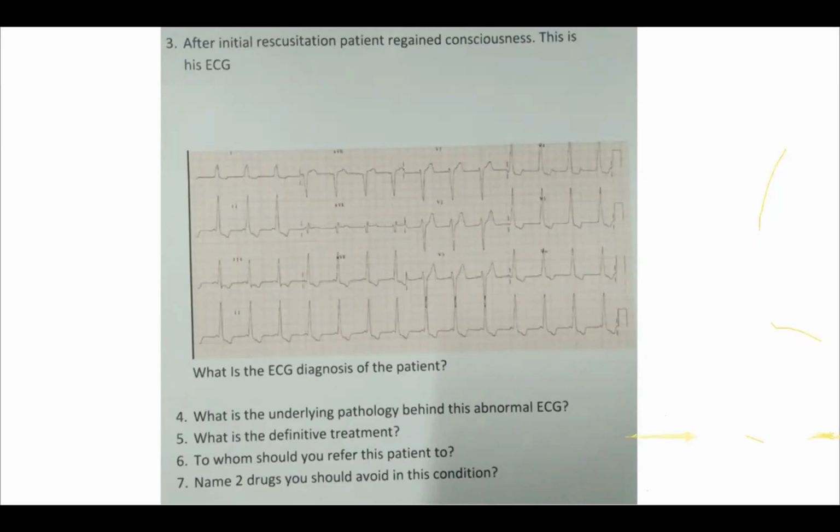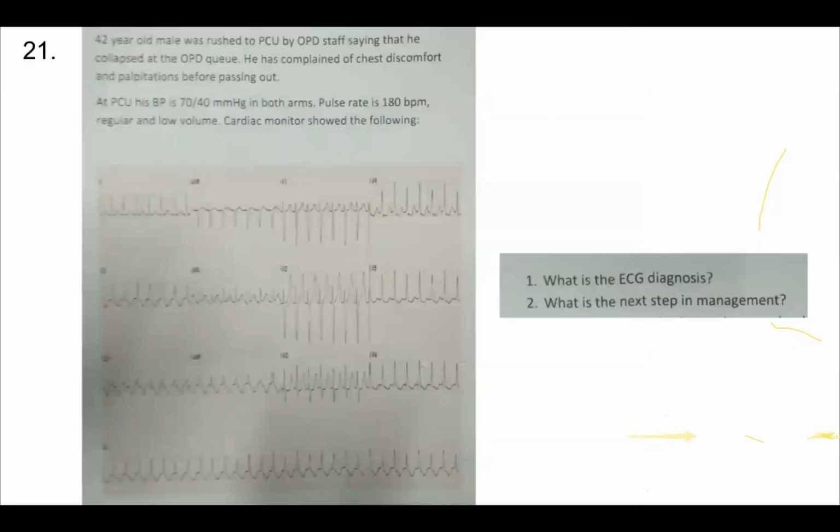But what they expect is, so usually in a person who has WPW, there's an entity called antidromic AVRT and orthodromic AVRT. In antidromic AVRT, you will see the broad complexes, not like this. So this is actually orthodromic AVRT, if at all, right?